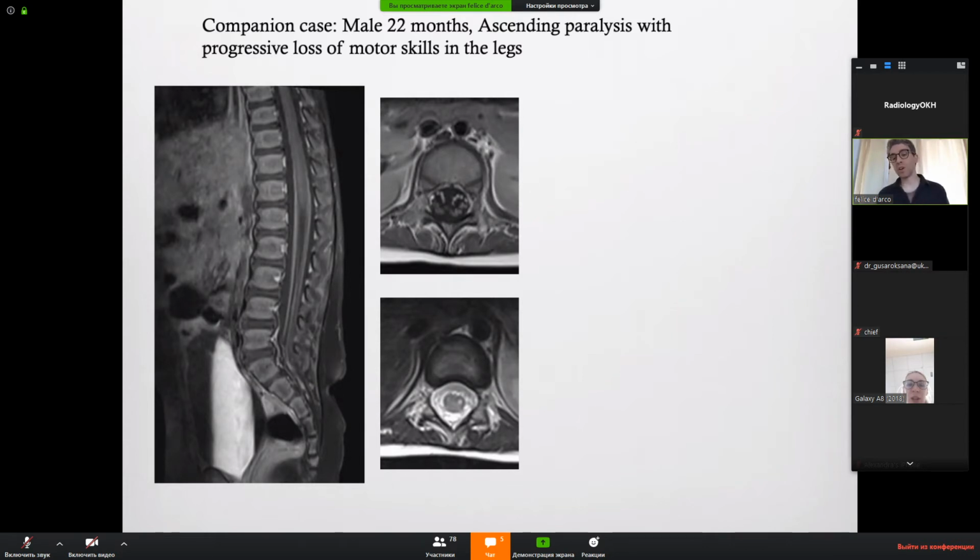And remember, the only way you can make the Guillain-Barré syndrome diagnosis on MR is giving contrast and looking in axial and coronal at the cauda equina roots. So in this case, you need contrast. But this is not a Guillain-Barré. This is another enterovirus. In this case, it was an enterovirus 71. But the point is that enteroviruses can give you lesions in the spinal cord, but also enhancement of the cauda equina roots. The difference with Guillain-Barré is Guillain-Barré will not typically give you abnormalities in the spinal cord, in the brainstem, and in the brain, but only this enhancement.